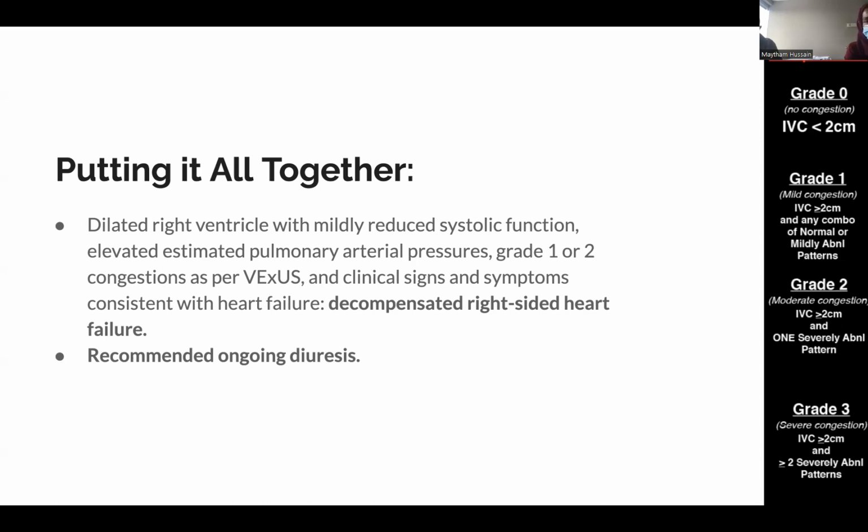So the nice thing about this case is, as Maytham was mentioning, VExUS was a really nice adjunct to use with his other imaging, his clinical history, physical exam, and lab work to paint an overall picture convincing of decompensated right heart failure.